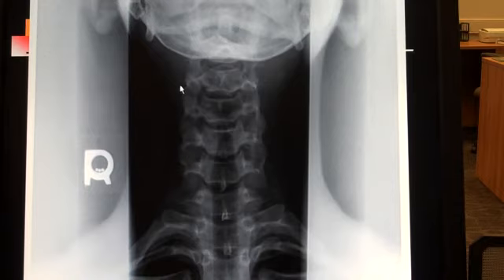We can see, of course, a little bit of that TP sticking out right there. And so it's coming across right here, and that whole thing then is your transverse process. If we look here in this area, we see that it's darker, and I'm just moving the mouse intentionally from there to there, and I can move down and still be, and that is the airway. So at the level of C6 and C7, we are on the tracheal air shadow.